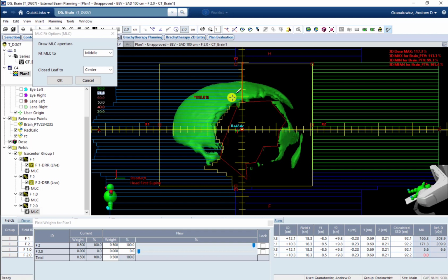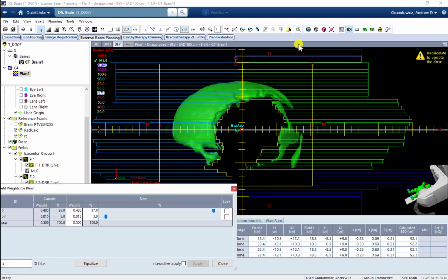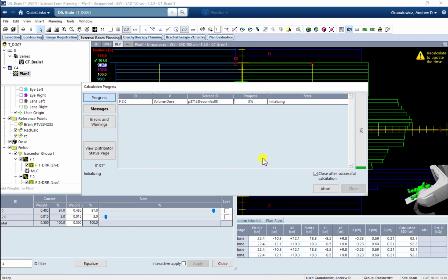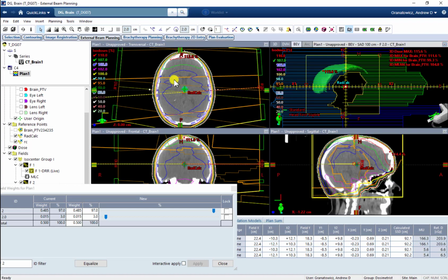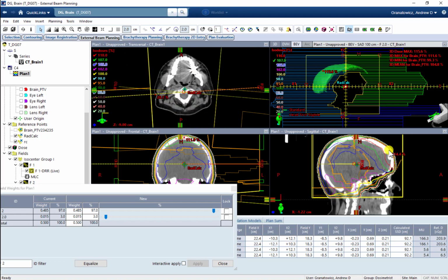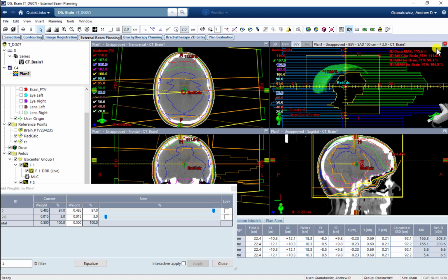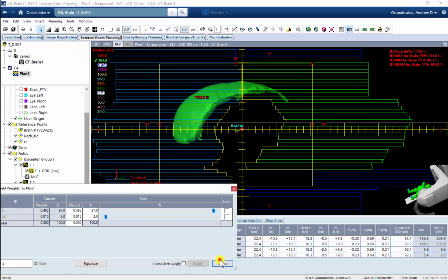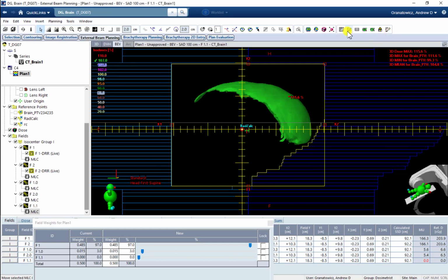You have to be a little careful though, because essentially we're traveling through colder spots to get to those hotter spots. So after we add this, we just have to double check the dose distribution in that area to make sure we're not causing any cold spots. If we look at our dose distribution, it still looks pretty good. That 100 line is covering practically the whole field, which is what you want. And we'll just keep going back and forth till all that 107 is gone.